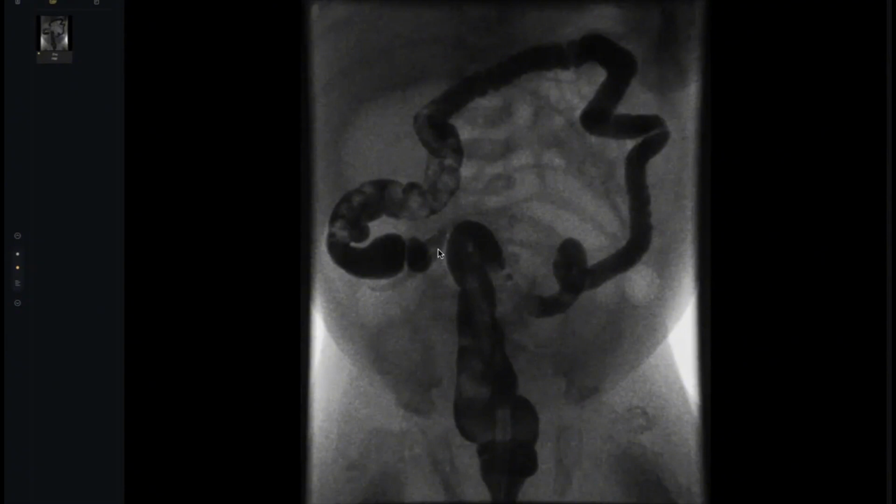Somebody will tell me, doctor, I know this is a bowel. No, this is the appendix. So the ileum is completely occluded. So it is ileal atresia. Somebody will tell me, doctor, but I can see a bullet-like filling defect here. Why can't it be meconium plug, meconium ileus?